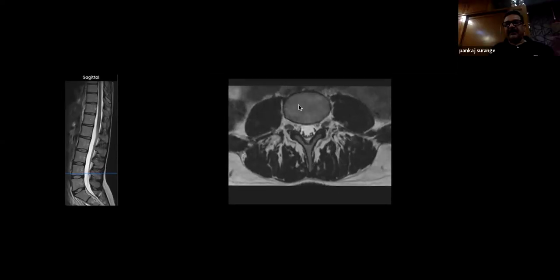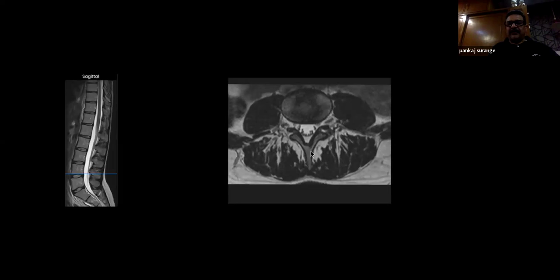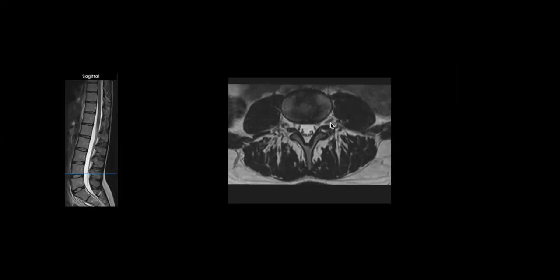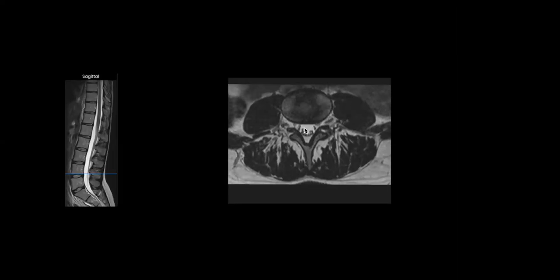So that's the color of the end plate. This is the color of the vertebral body. It's a diffuse, slight grayish color. When we reach the end plates, it will look like this. Okay. As you start going, now what has happened to the root? Now look at this. Another root has come out. Now this is your traversing root. Okay. This is the exiting root and that's the traversing root. Rest all roots are within the thecal sac. Understood?